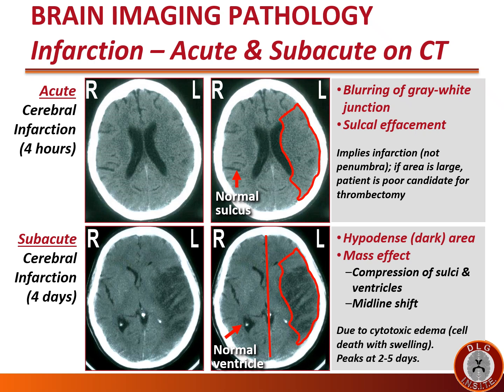So much of this person's left cerebral hemisphere in the middle cerebral artery territory, the cortex is darker than usual. It's as dark as the white matter. That's blurring of the gray-white junction. And there is effacement of the sulci. In other words, the wrinkles or sulci are pressed on the left. Notice they are normal on the right.